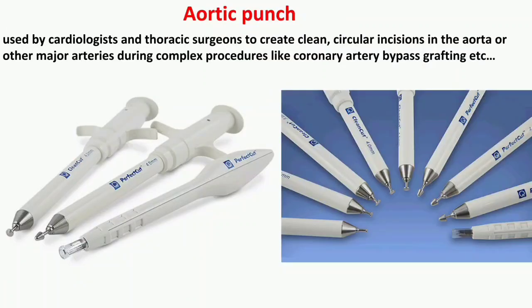Aortic punch. Used by cardiologists and thoracic surgeons to create clean, circular incisions in the aorta or other major arteries during complex procedures like coronary artery bypass grafting, etc.